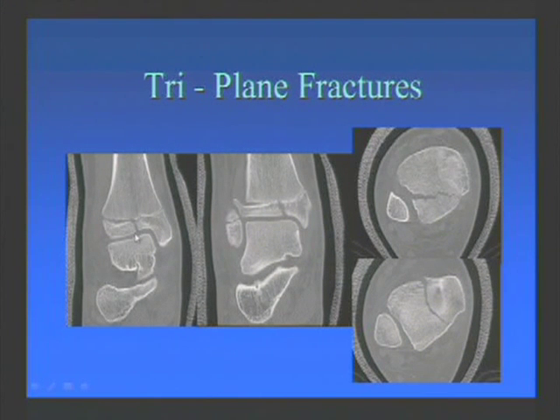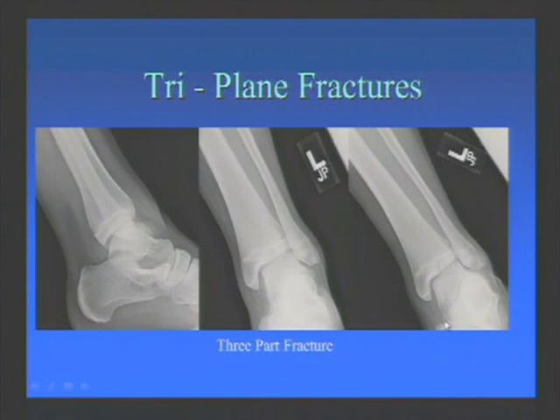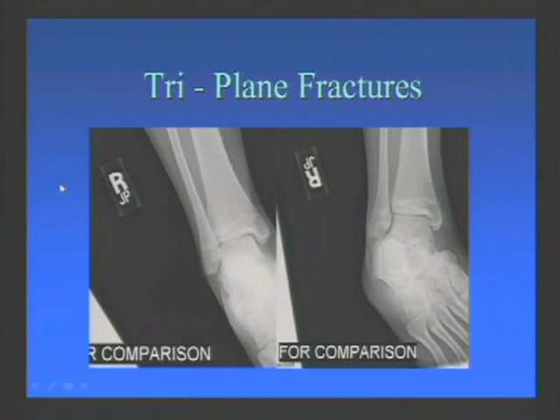This is technically a Salter-Harris type 4 injury. You know, it's got a metaphyseal component, growth plate component, and epiphyseal component. A 2-part fracture just has 2 lines running here, whereas if you have a 3-part fracture, from the radiographic component, it is very difficult to distinguish. This one looks an awful lot like the other one. There is the sagittal plane epiphyseal fracture. There's the slight asymmetric widening of the lateral growth plate, which I wouldn't call other than I know it has to be there because there is an oblique coronal plane posterior fracture.